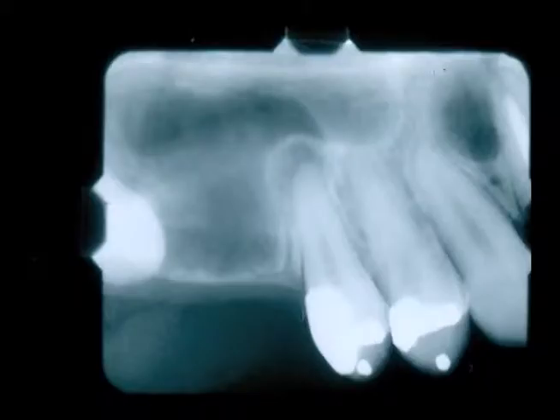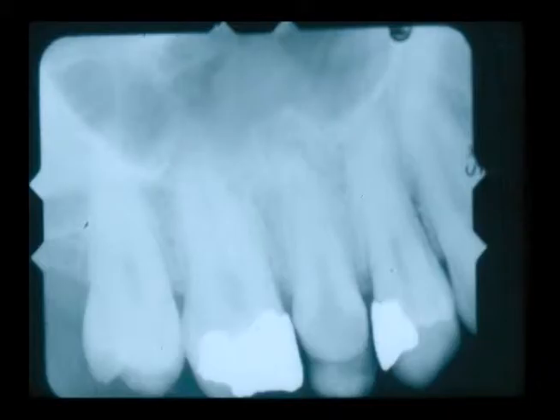Here we see another example of a deep restoration with a halo shadow over the second bicuspid. Although not as clearly displayed, one can see that the second bicuspid has a fracture, has deep caries, and indeed is non-vital. We can see a very small area of halo shadow or periostitis, and above that we can see the mucosal response of a mucositis.